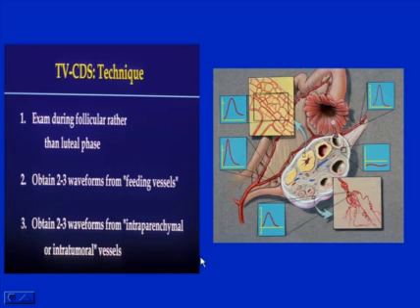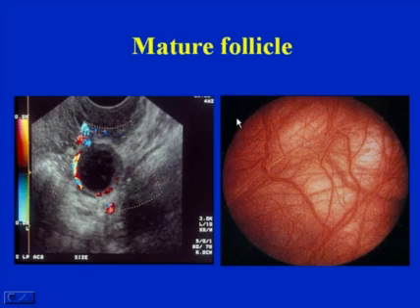So what color Doppler is very good at is telling us what the physiology is involved with the normal ovary and ovaries that contain masses. And of course, where there's no follicular development, the vessels are very tightly coiled, and the impedance value is very high, as opposed to areas where there's a vascular arcade in a corpus luteum, where there's increased diastolic flow.